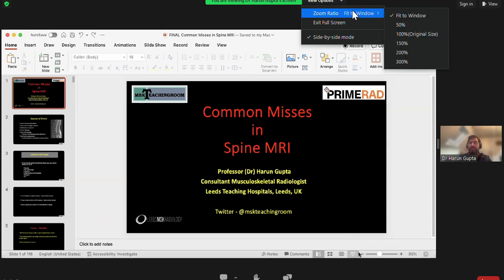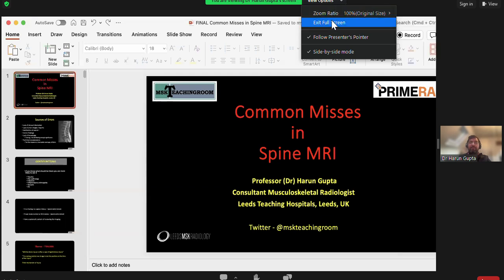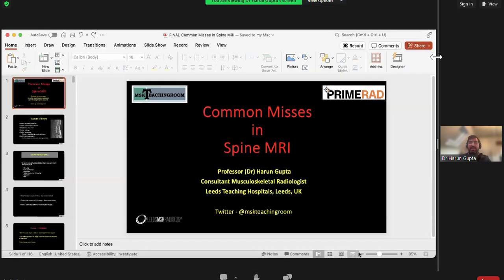Typically, it is reported quite fast. So we all know how quickly the spine MRI reporting happens. But equally, we have to be mindful that small important things can be there which can be missed and can make a huge difference to patients' management.